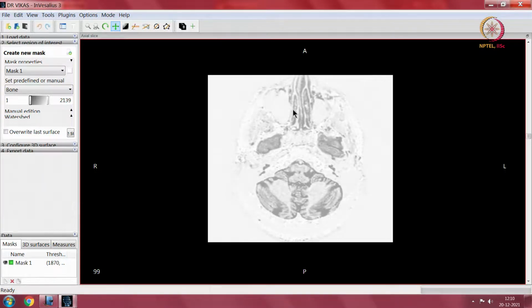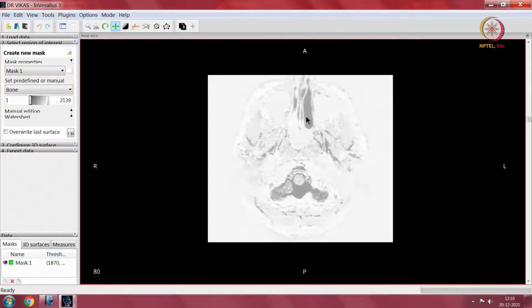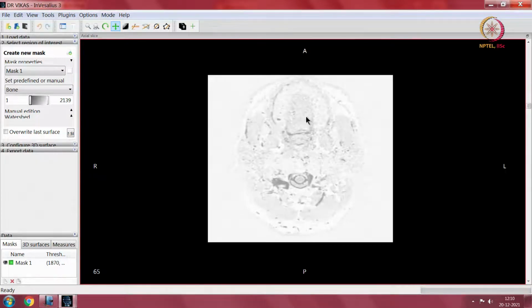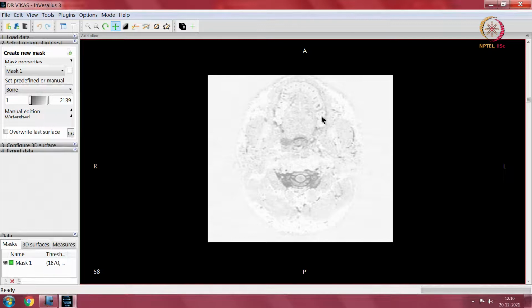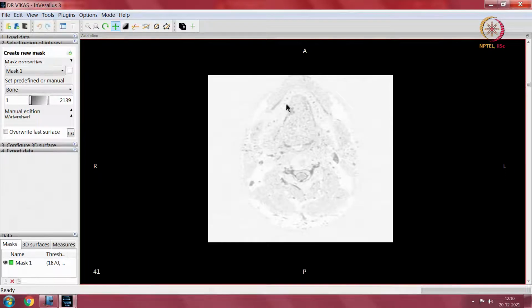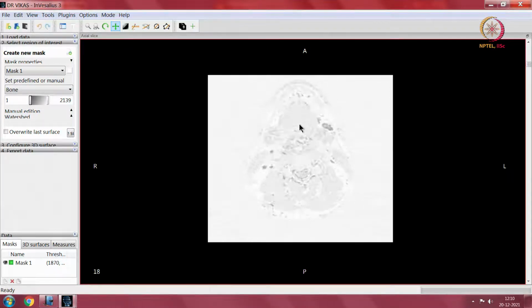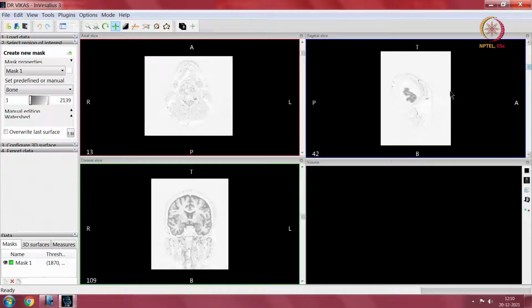This is the paranasal sinuses on either side. This is the nose again still. This is the teeth. Okay, so teeth, jaw, teeth, lower, meaning the lower part of the teeth, and so that's the lowest most part of the structure.